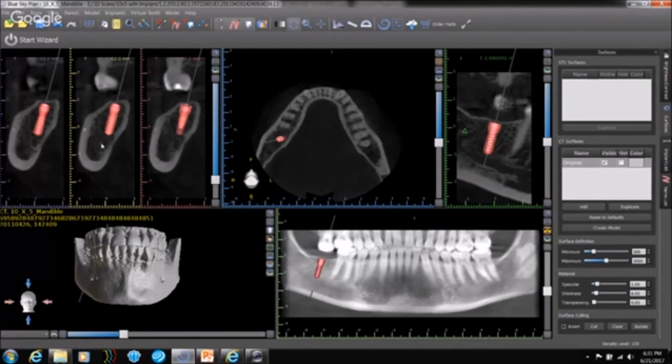You also see the mental foramen very clearly. You can see the superior border. You can see the entire circle. So in a few images, in certain views, you may be able to get a little bit more of the cortical bone and the cortical structure of the inferior alveolar nerve canal, indicating a healthy path. You can also see in the segmented panoramic view that you see over here very clearly in relation to the implant. I've already placed the implant.